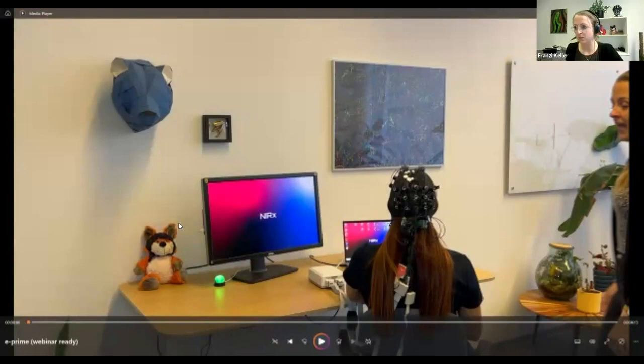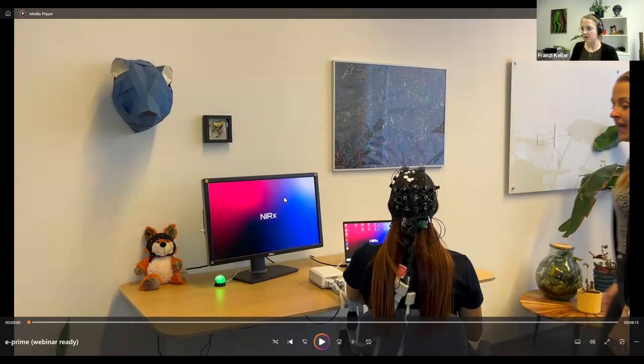And now I'm going to share my screen again, and I'm going to show you the pre-recorded demo. Because, you guys at PST, we didn't have a real device, so we wanted to show you what the use of the E Prime extension for NIRx looks like with a real device connected. So I'm going to go ahead and share my media player. Can you all see my video screen? Yes. Perfect. So then I'm just going to let the video run through. And again, if you have any questions afterwards, happy to take those. I hope you'll be able to hear the sound.